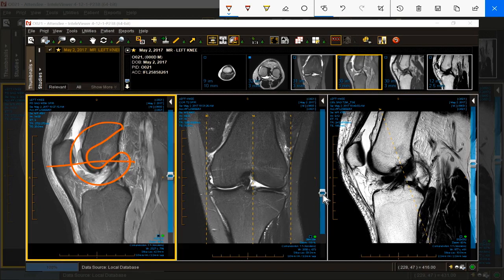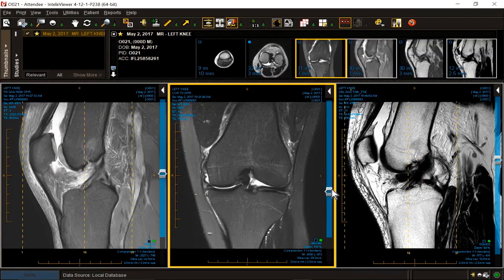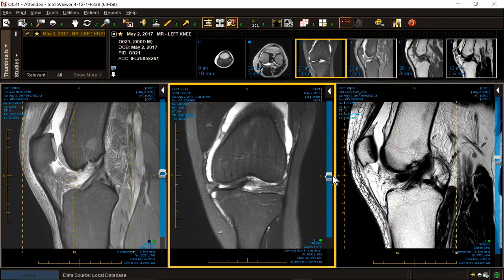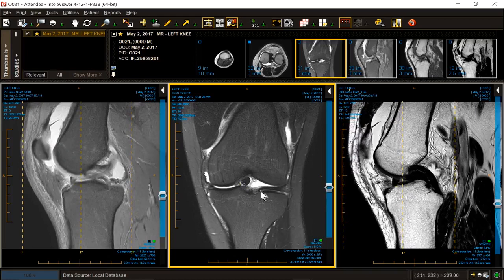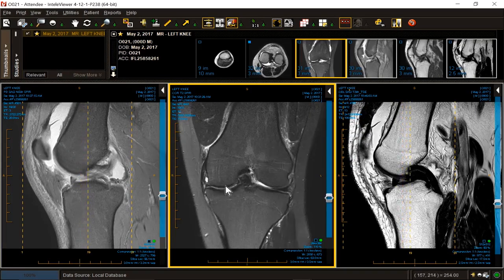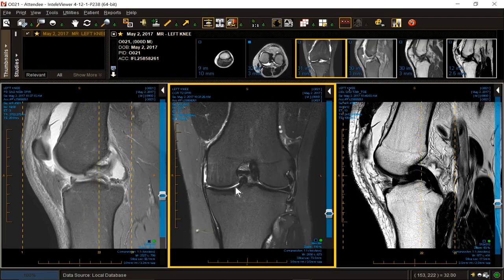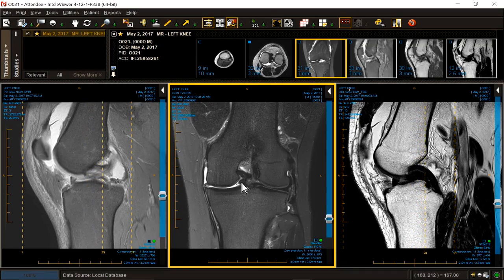We know that's not true because it's on every single cut. If this were the case, maybe one cut. But look at every single cut, and we will find a piece everywhere. In the front, there and there, it's getting bigger. We'd like to see it come back together.